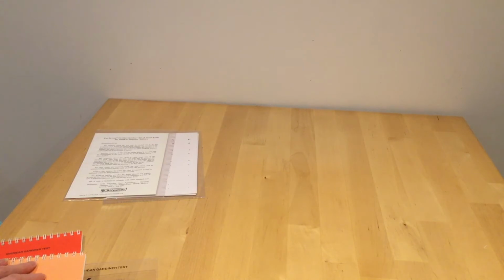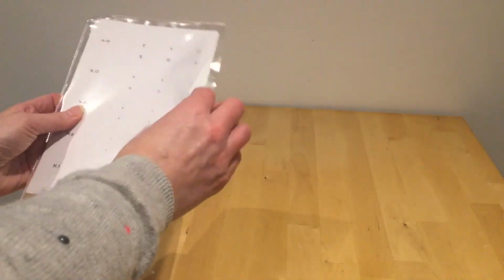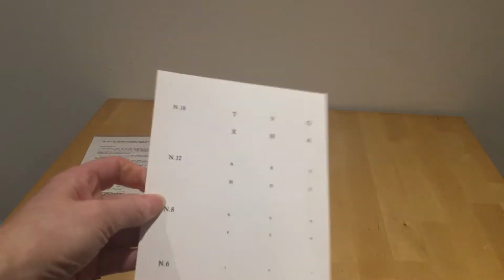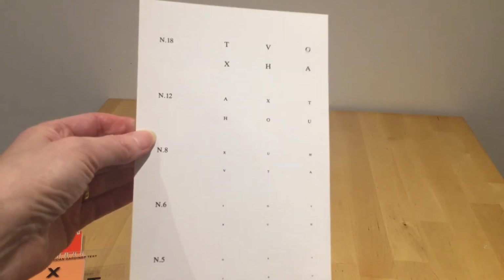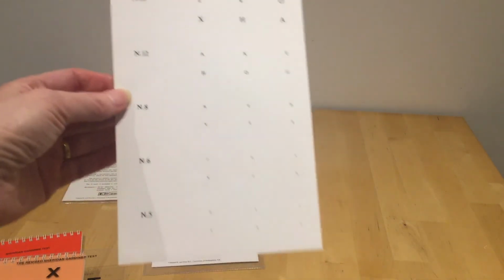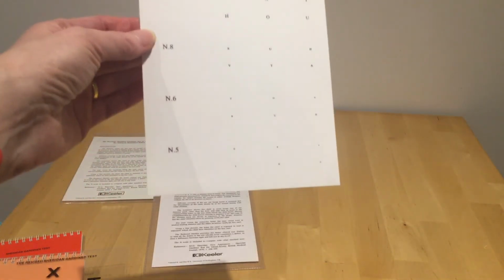Now, interestingly enough, they do have a near vision test, and here it is here. So near test, but it's starting at N18, and it's single letters, not crowded, well spaced out, and again you can use that transparent key card again.